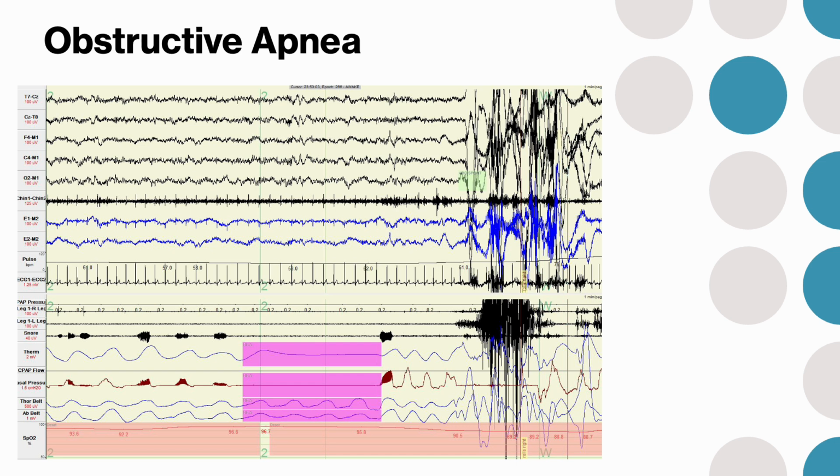You can also tell this is a legitimate apnea because here the snoring stops, and there is no airflow at all. They can't even get snores out until right there. And then they get nice full breaths. And I'd put the arousal over here. There's more alpha here, but this is where the ISR would score it.